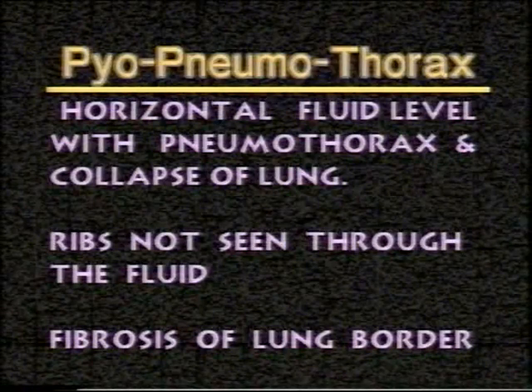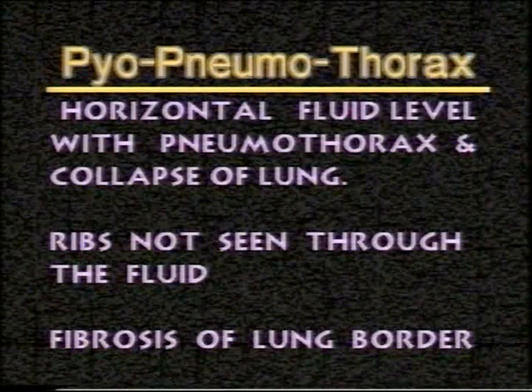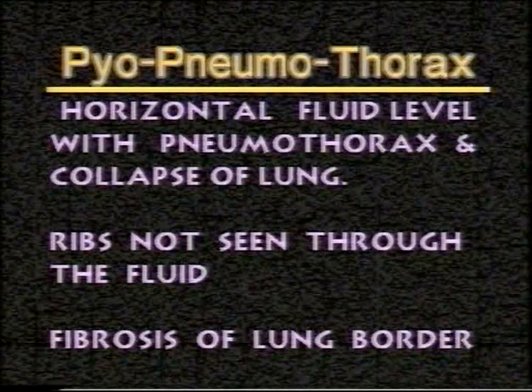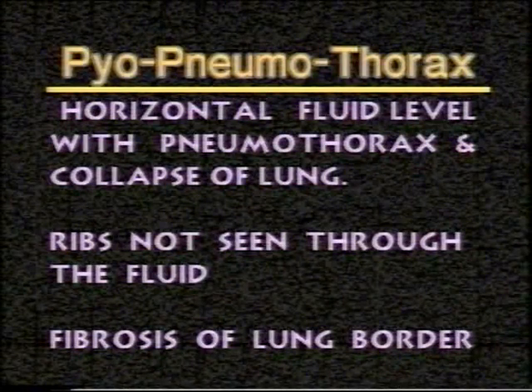Now, how do we make out whether the fluid is pus or a simple serous fluid? It is not possible to distinguish it with certainty, but suspect a pyopneumothorax if the ribs cannot be seen through the fluid and if the lung border shows a lot of fibrosis.